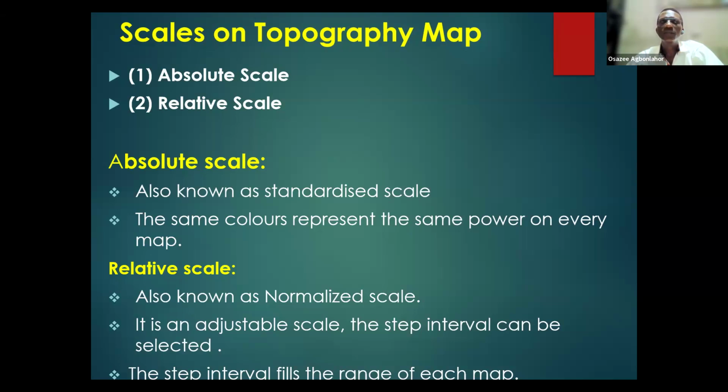Then from 5 or 6 to 10, it's the lighter blue like that. You cannot alter it.